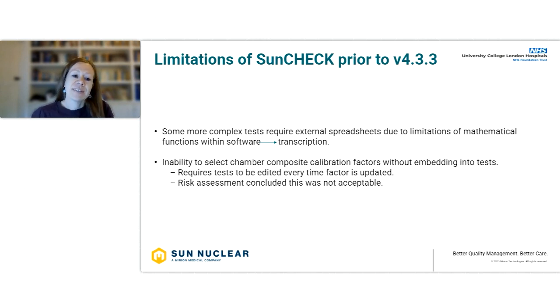But the main reason we didn't start with our TrueBeams is that there wasn't an ability to have a chamber library and be able to pull in calibration factors. So we would have to get the user to enter these themselves, again, risking transcription errors, or somehow embed them into our calculations within the template. And then that poses problems when we do our annual cross calibrations and want to update factors. We then have to find every template that's been used in and update it. So at the time, our risk assessment said that wasn't a great idea.